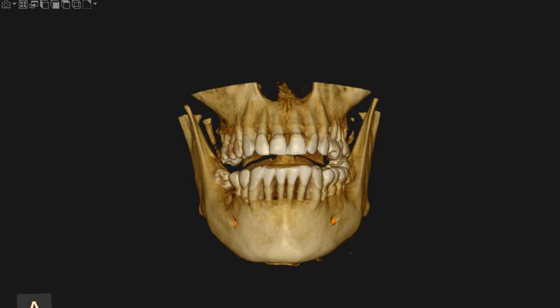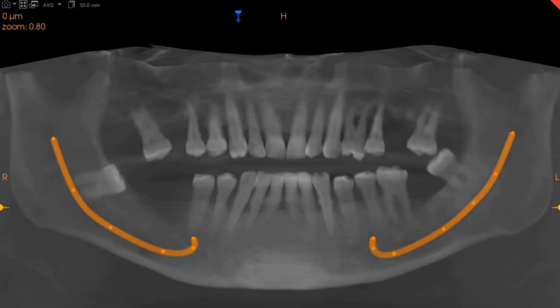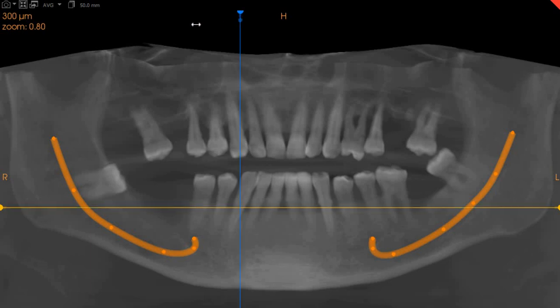This is the CBCT of Ultrascan Diagnostics. The area of interest is basically periodontics, as the doctor has mentioned. We've got very severe periodontal disease in this patient. The upper right quadrant, distal to the second premolar and the second premolar itself. As you can very clearly see, very severe bone loss.